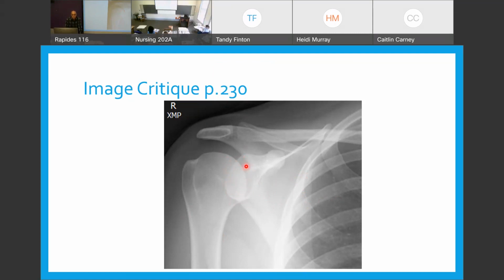The lesser is going to be pointing medially. So which rotation are you looking at? Internal. Internal is going to give you that triangular lesser. Remember to show triangular. This is your lesser right here. It's way away right now.